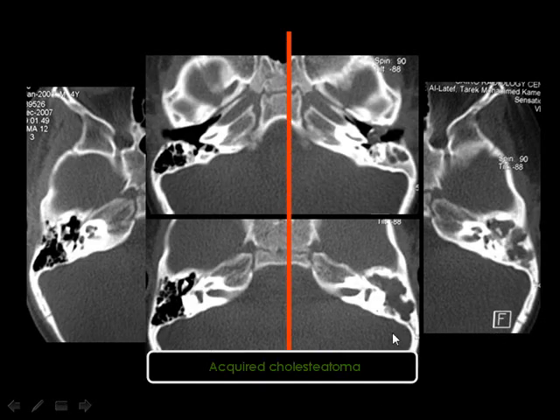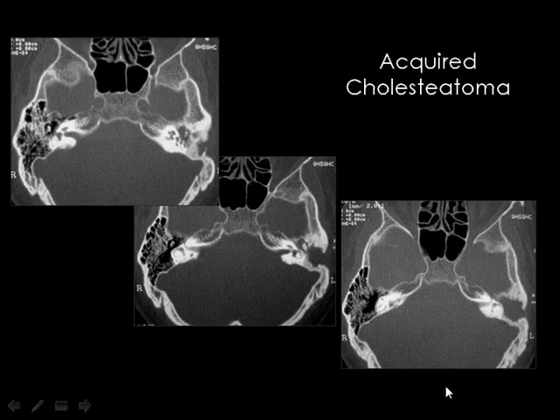Then can you say for sure this is otitis media or cholesteatoma? Yeah. What do you think? Yes, this is cholesteatoma because of this appearance. This is the non-dependent opacity, number one, and the marked destruction of the bony walls of the middle ear cavity, and also the destruction of the ossicles. This is another case of cholesteatoma with destruction of the mastoid antrum and the mastoid air cells.